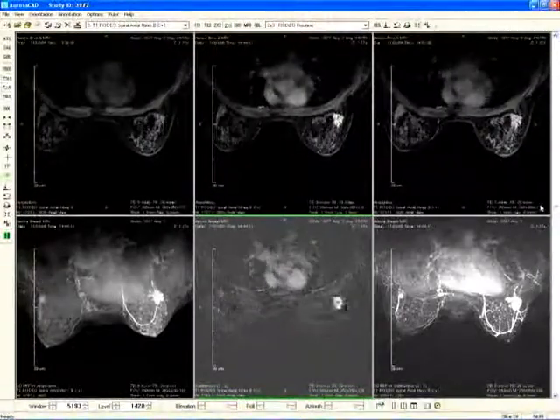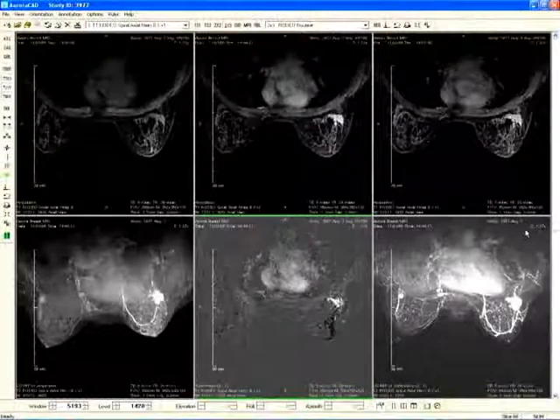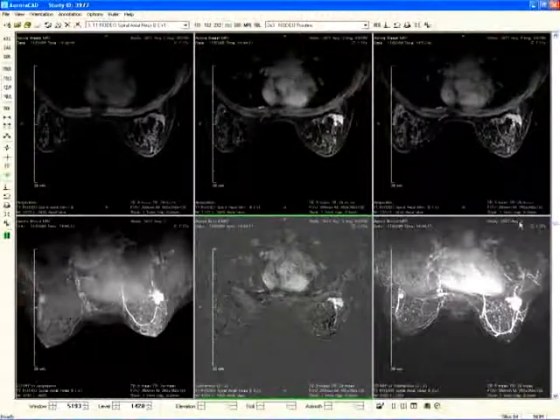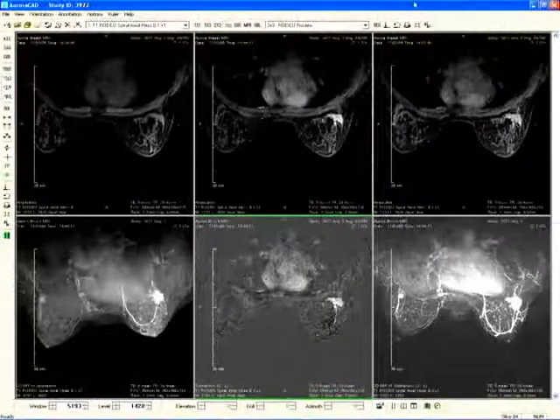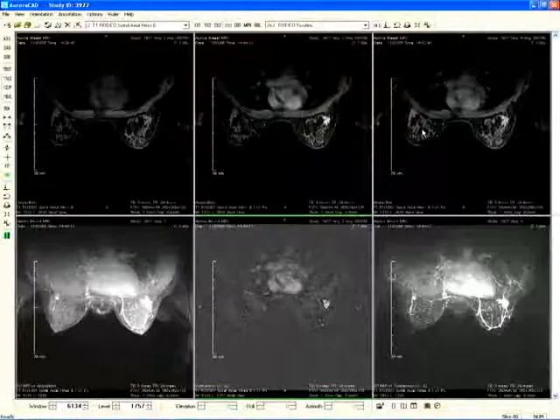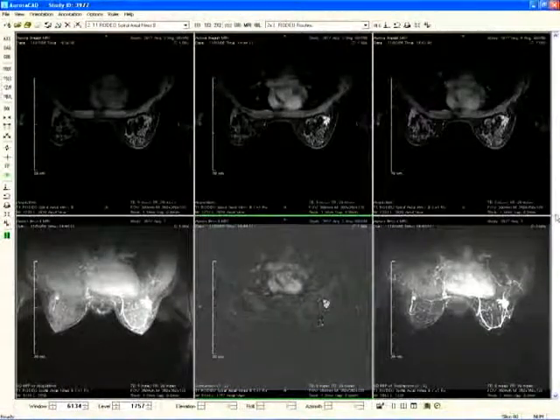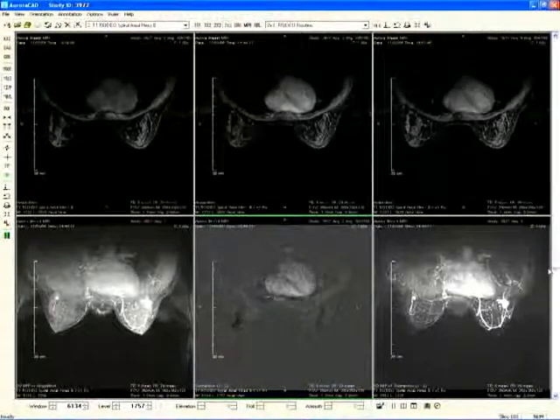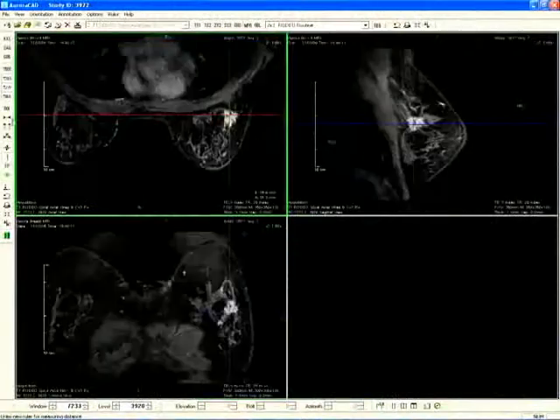In this patient, we have an etched look to the subtracted images. This is due to misregistration of the subtraction. We press the registration button and all the images are registered and the frames updated. The enhancement curve points are also corrected with the registration process.